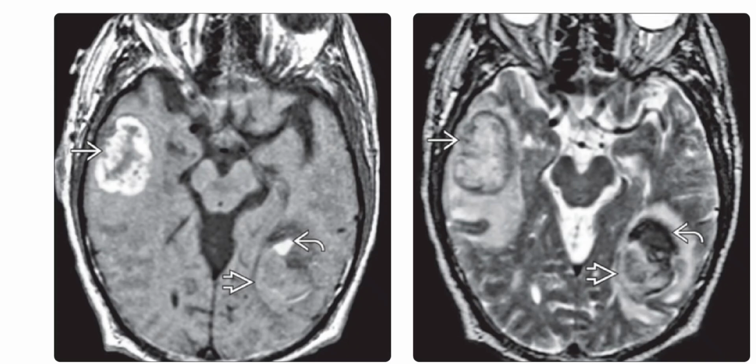Left is the axial T1 weighted MRI, and it shows hemorrhages in an amyloid angiopathy patient. There is a hyperacute isointense and an acute early subacute that is hyperintense left posterior hemorrhage, as well as a late subacute that is hyperintense right temporal hemorrhage.